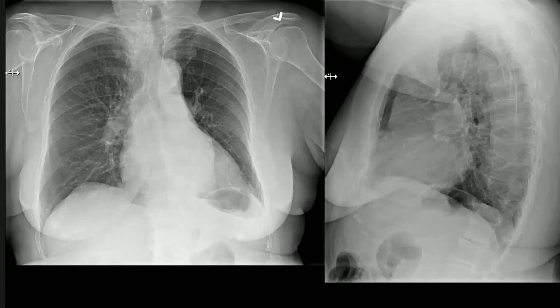So the endobronchial lesions include, sir, carcinoid tumors, and if it would have been a metastatic lesion, I would expect more lesions in the lung parenchyma as well. So I'm thinking of a central endobronchial carcinoid tumor, which is causing collapse of the lung segment.